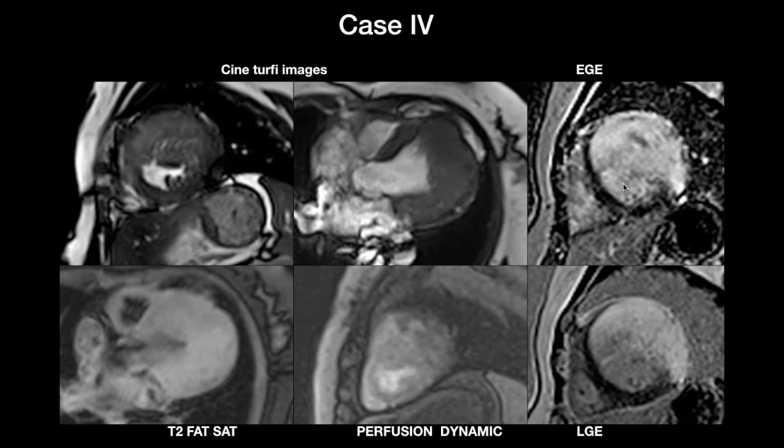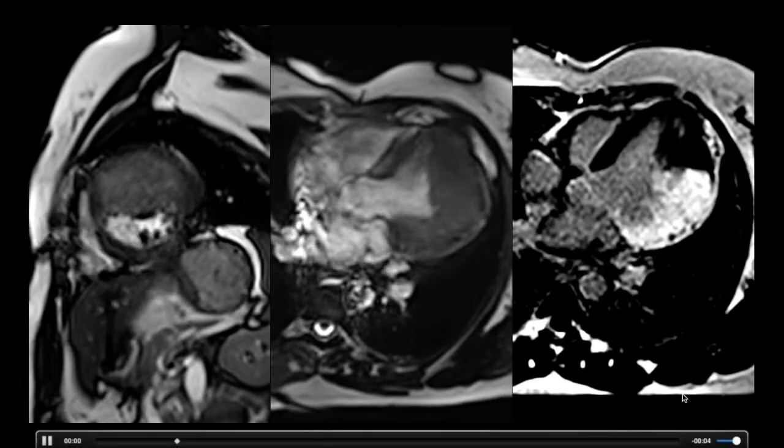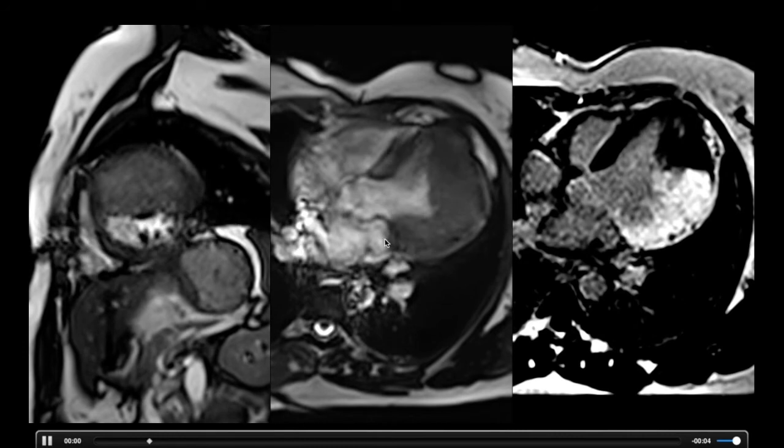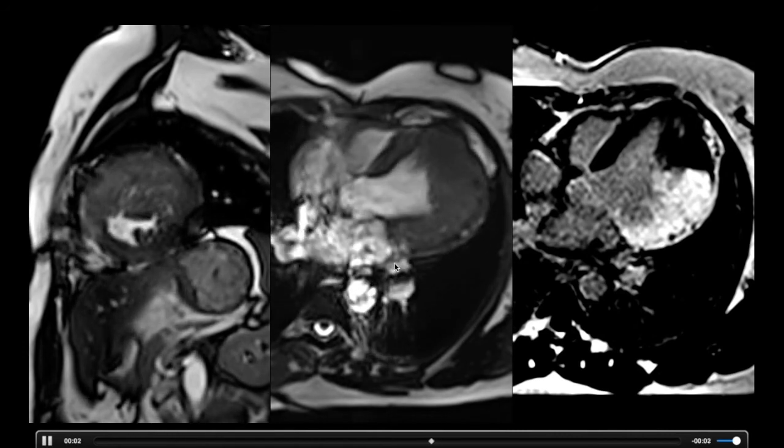Perfusion scans show early enhancement, with both early gadolinium and late gadolinium enhancements showing intense enhancement within the lesion with ill-defined margins. Is it crossing anatomical boundaries? Yes, it has gone to infiltrate the pericardium with enhancement, and it is encasing the coronary vessels. The LCX, which is seen along the left atrioventricular groove, is encased.